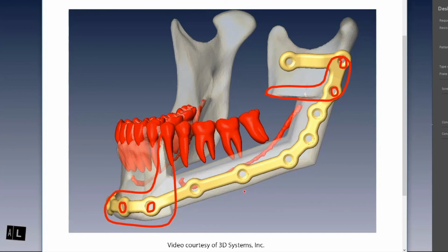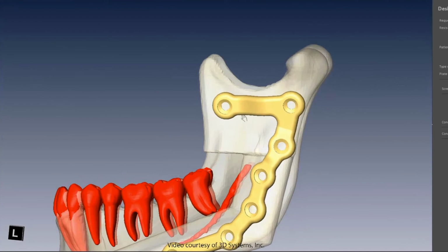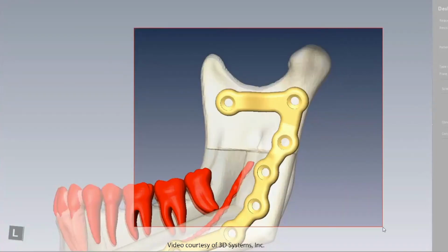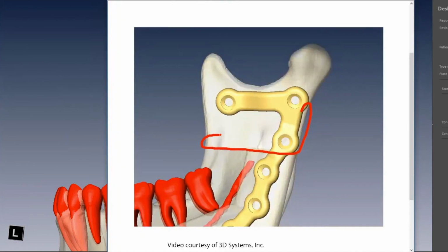Okay. Can I see an outline of what you're going to be doing for the posterior guide? I'm not so worried about the anterior guide. So where is your guide going to be sitting at the back when you design it? So we would definitely favor our registration on the posterior ramus with the marking wall there. Totally up to personal preference, but we do have an option to reach up and attach a small hook to that sigmoid notch as well.